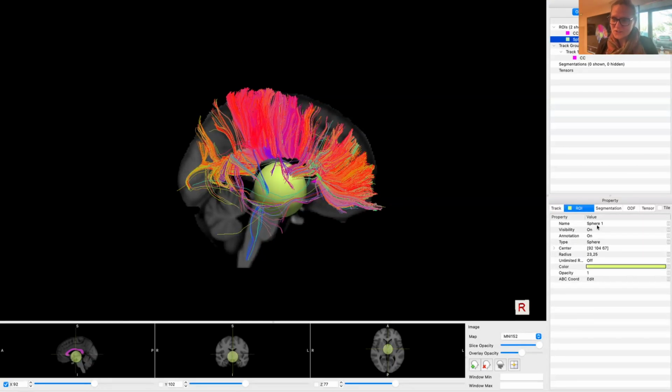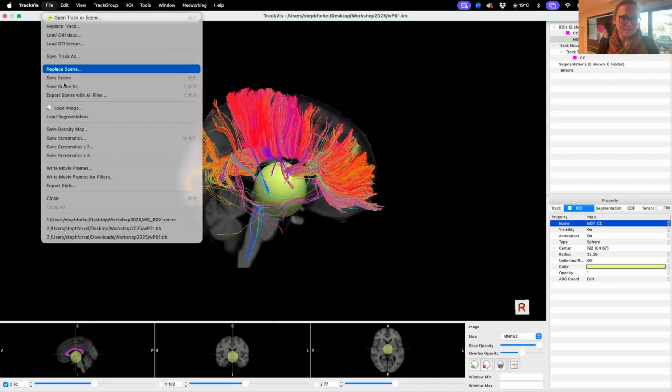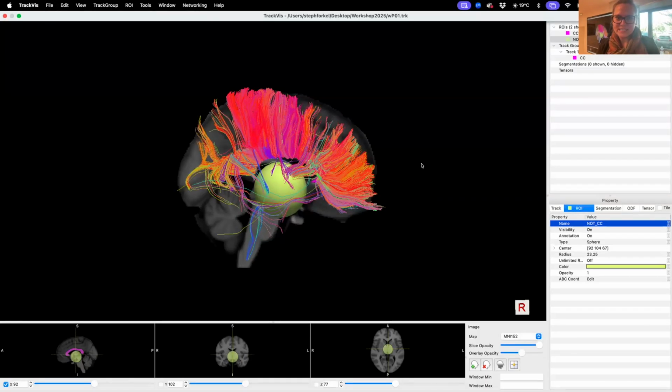So what I was going to do is rename my sphere to not CC.